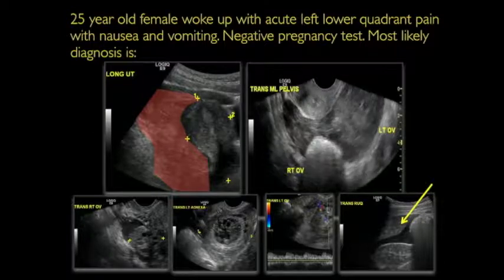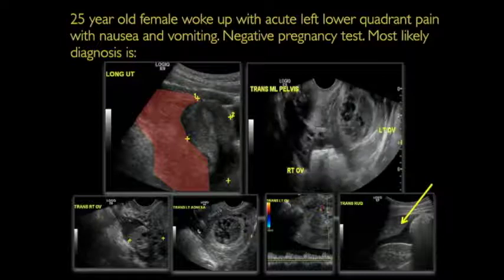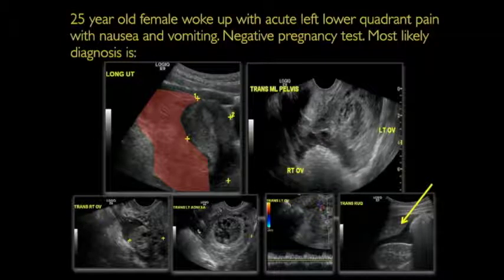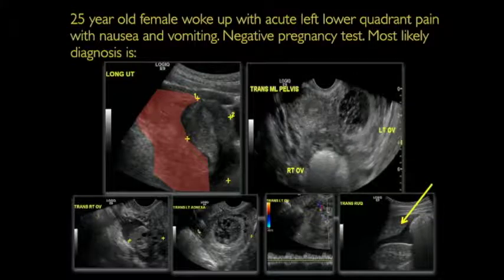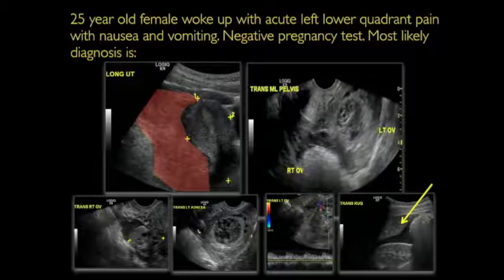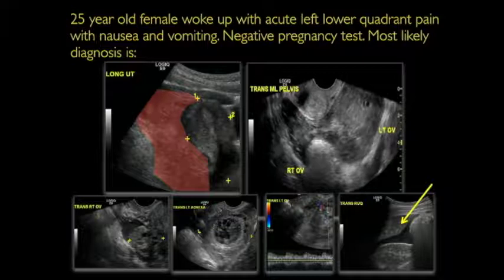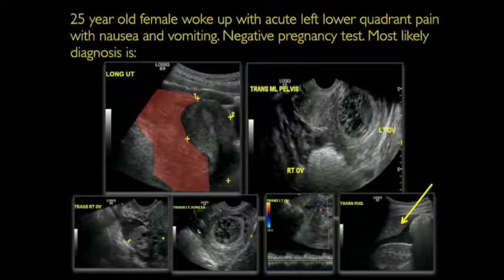In this case, with a proper clinical history, this is almost certainly just a simple hemorrhagic event from a physiologic hemorrhagic cyst. Now, the residents might say, well, pus and blood are supposed to look the same in the pelvis or really anywhere. How do I know this is not an infectious process? It's unlikely to have this much material within the pelvis and the patient doesn't have any symptoms of a severe febrile illness.